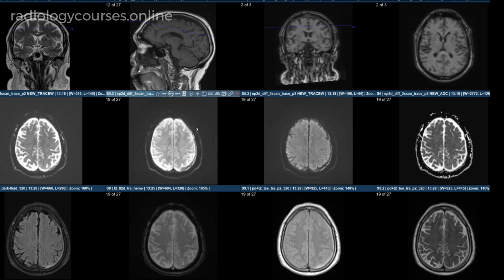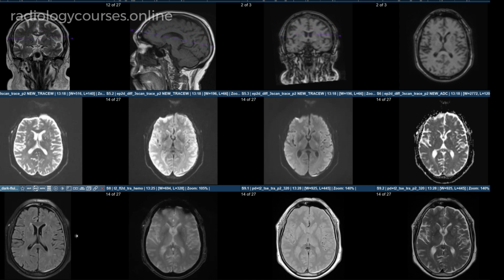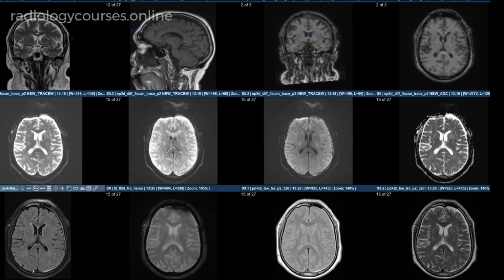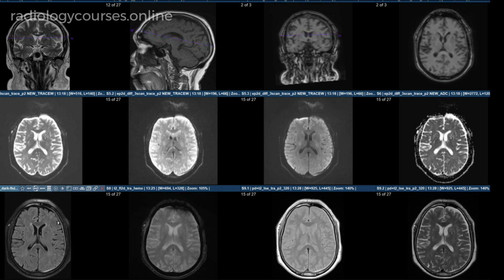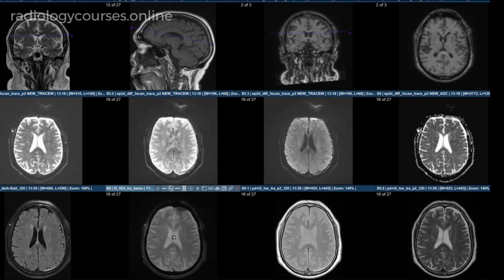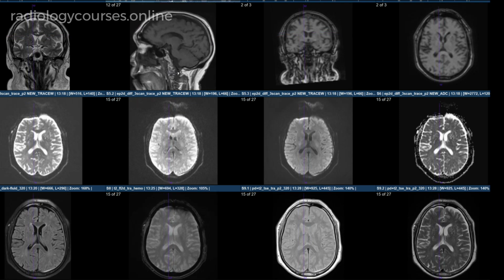infarct, we recognize there is abnormality along the left cerebral convexity. So when we look at that region on the axial FLAIR, we see abnormal signal and thickening along the subdural space in the left cerebral convexity. There is mild effacement of the underlying sulci and gyri, but there is no mass effect. This abnormality is not much appreciated on gradient echo, PD, T2 or on T1 sequence.